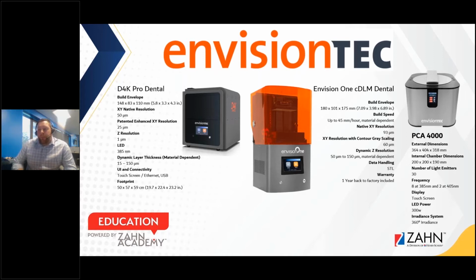Like I said, the build platforms are a little bit smaller on the D4K, but it doesn't mean the build times are going to be any different, because they both utilize the same type of technology that's going to be more efficient for the printing process that we see here. They're both a DLP style printer. Coupled with the light curing unit, it's going to be a great process to infiltrate the printing market here on the dental side, especially with all the new materials and different offerings.